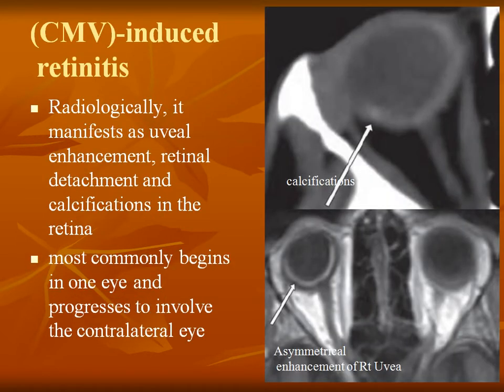Okay, so it manifests radiologically as a uveal enhancement. You can see this is the uvea, and it shows here a focal area of enhancement. Okay, sorry, focal area of fine mild calcification in the retina, very thin area of calcification.